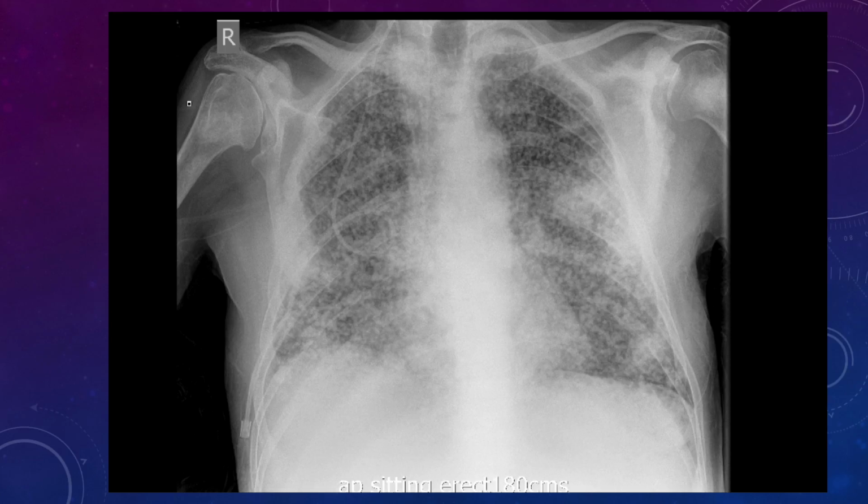So now this patient has got a chest x-ray. We find we've got a bit of remodeling and dysplastic shoulder joints bilaterally. Both the glenoids and humeral heads aren't right. That might just be a bit of a red herring. We've got a Hickman line or something, so this patient's having treatment for something. The nodules are dense. They're all quite similar size. Some are a little bit larger. Some are quite small. We've got a focal density here, probably a focal density here. And we've also got something going on here along this lateral chest wall.